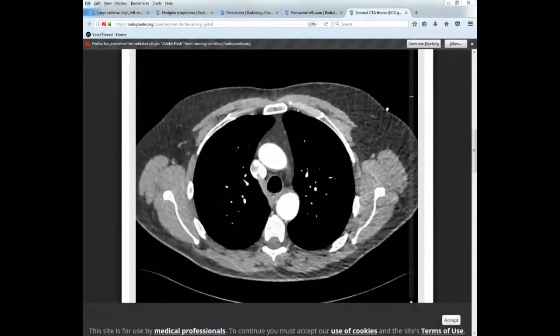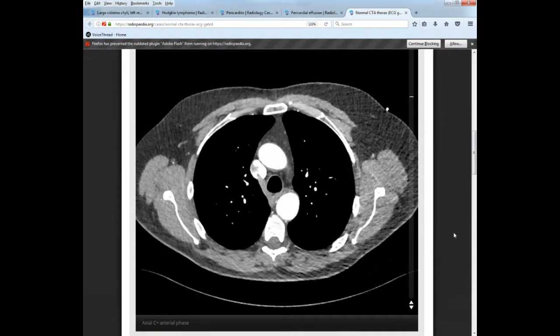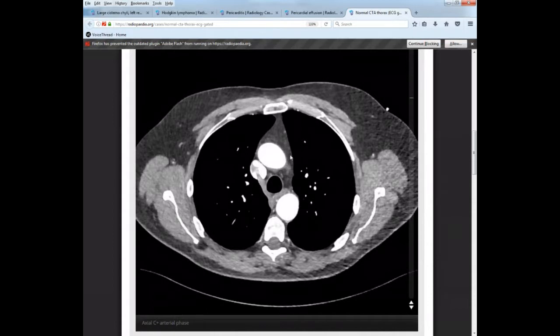So we'll start this week talking about the thymus gland. Now the thymus, remember from lecture, is very difficult to see in an adult patient because as we age, the thymus itself just gets converted to fat. We don't need to develop our immune system as we are older. So an adult patient is just going to have, like you can see here on this CT, a fatty area posterior to the manubrium and anterior to the aorta.